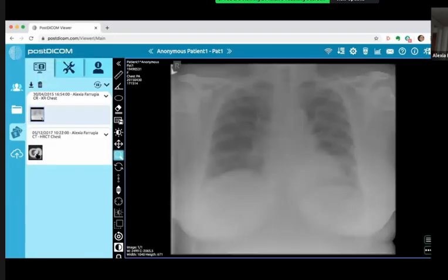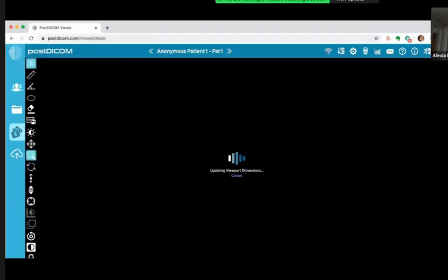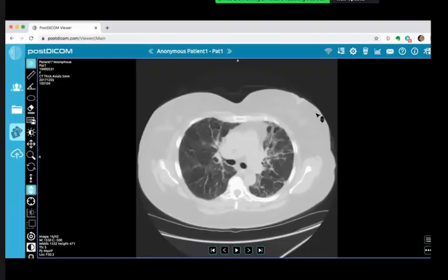Apologies for the quality. That wasn't the best, but she has quite a nice CT, which I wanted to show you. Yeah, no, I think the image is on my side actually, so the connection on my side is quite bad. Oh, okay. Can you see the CT now? Maybe yes. Okay, I'm going to start scrolling through it. Focus on the lungs. Okay. And she's 50.